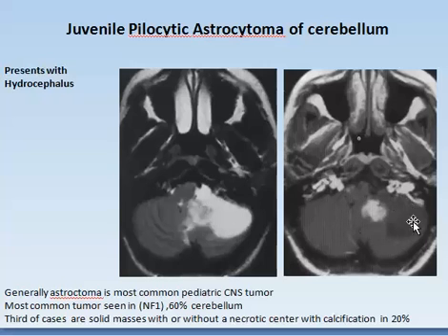It is rather in the left hemisphere. Still, we are in the cerebellum. It presents with hydrocephalus compression, large enhancing mural nodule, and large cystic component. One third of tumors may present as solid only without cystic changes.